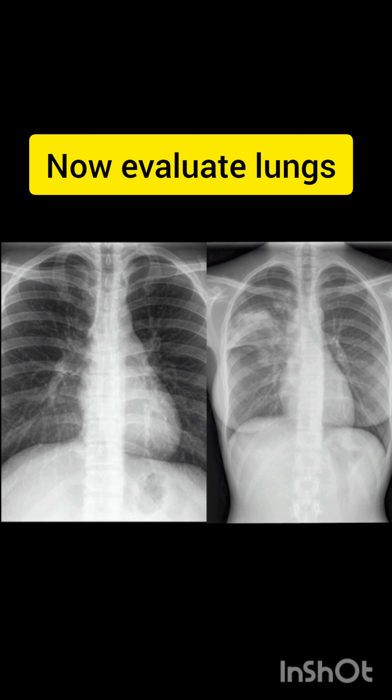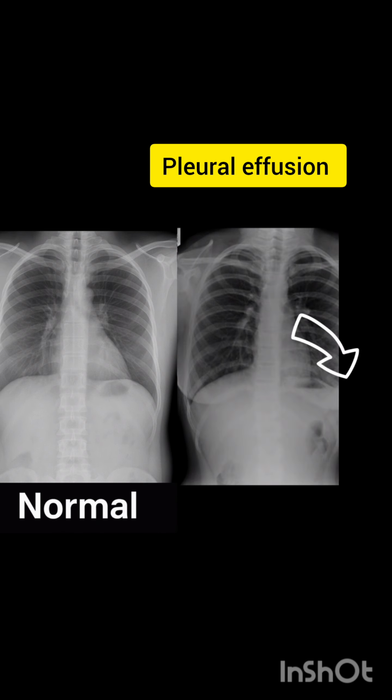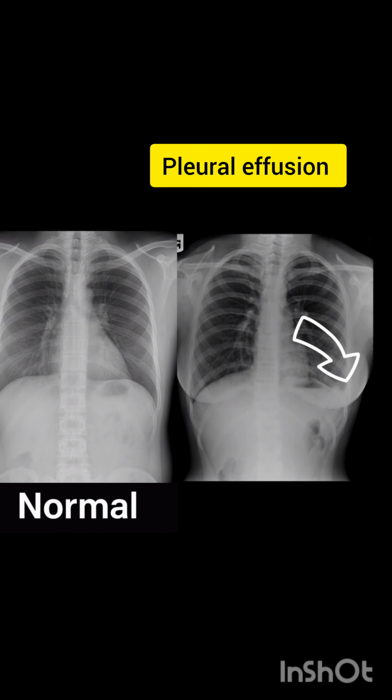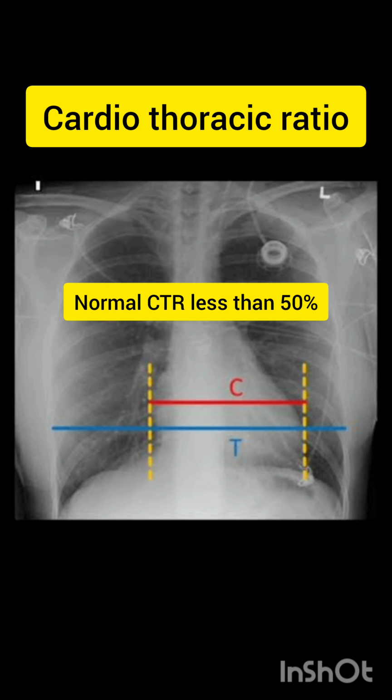Next, evaluate the lungs. Compare both sides. Look for consolidation, pneumothorax, pleural effusion, or hyperinflation. The heart should be less than 50% of thoracic width on PA view.